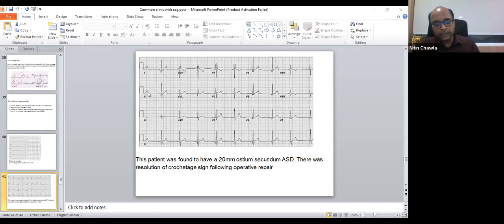And in a few ECGs I have shown that the P wave has a wandering rhythm. The P wave is abnormal, while the QRS is normal in those ECGs. Labeling those children as wandering pacemaker will help you identify congenital sick sinus syndromes or other congenital defects, even rhythm disturbances caused by scarring after surgery. Because of that also, you will be able to identify it if you go structurally.